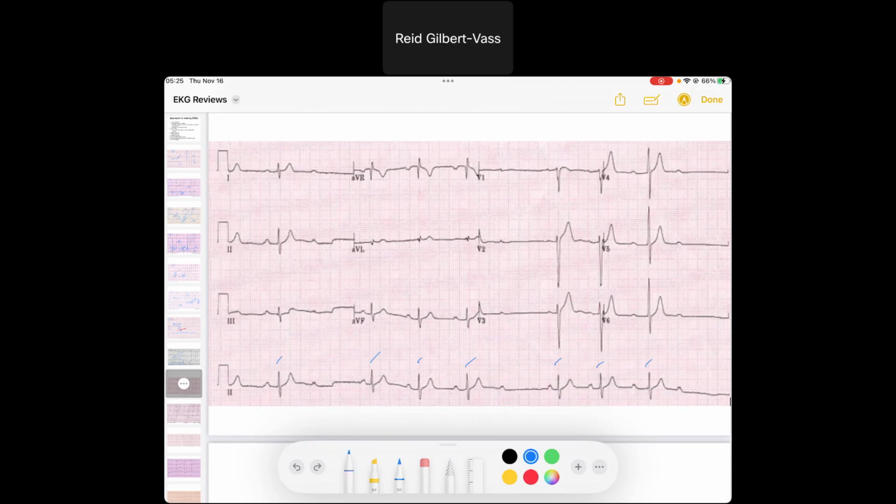And so what's the atrial rate doing? Well, we've got some P waves, and those P waves are up in lead 1 and up in AVF, so these are sinus P waves. So let's see, are they conducting to the QRSs? I've got a normal AV node function on this beat, and then maybe it's a little longer there, maybe a little longer there, and then we have a P wave that does not conduct to a QRS. Then it resets, and we have a normal PR, and then it gets longer, and longer, and we have another one that doesn't conduct.